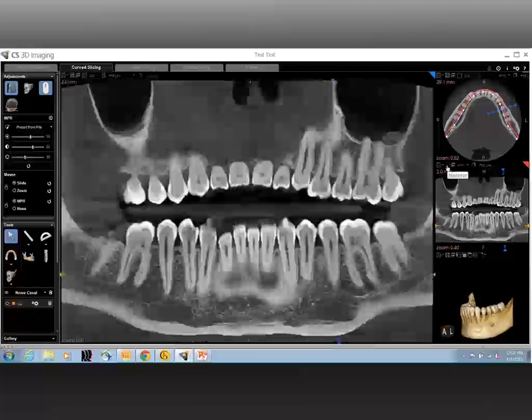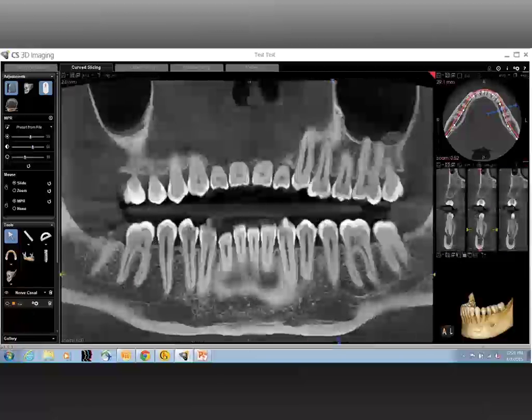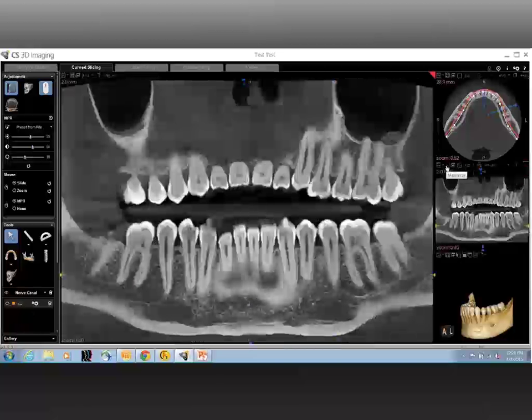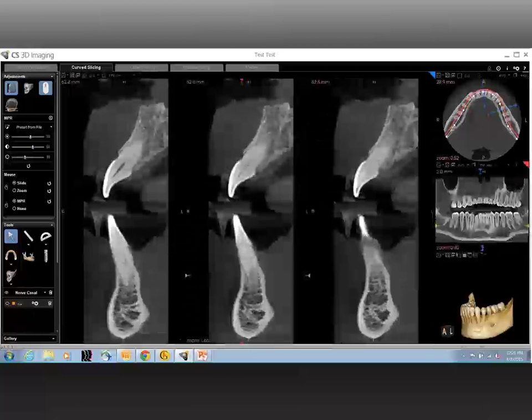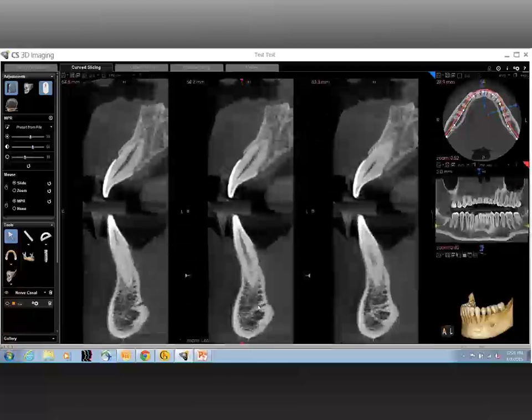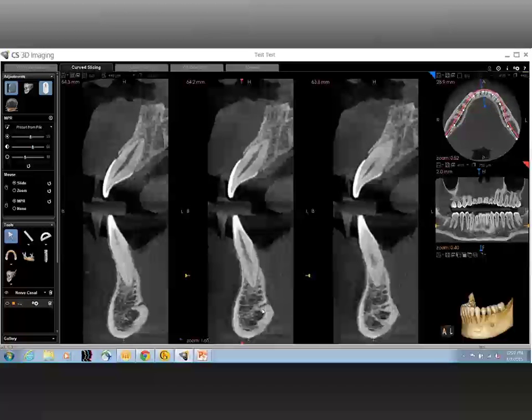Excellent. I think that should explain that. You mentioned the lingual foramen. If you would, I believe we'd find the lingual foramen right in the midline in the mandible. If you could show us that also. Let me just scroll around and get to the exact view. That would show the lingual foramen. If you notice, it's just like the name implies. It is on the lingual surface, and that's where it is.